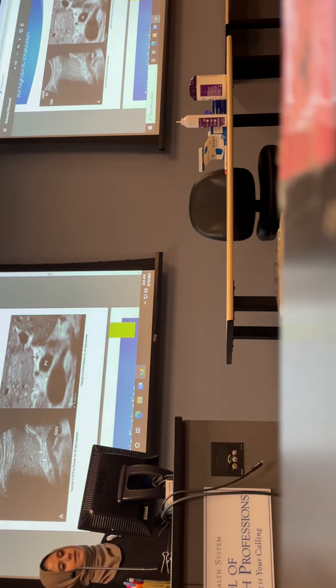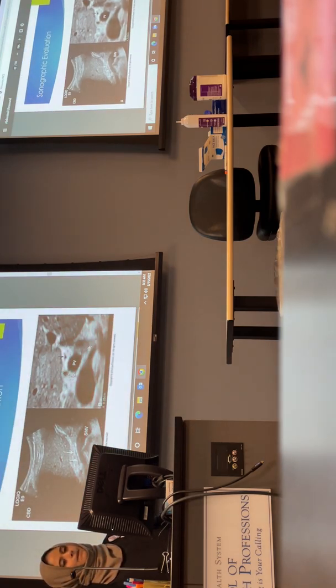What is the sonographic sign right here, guys? The Mickey Mouse sign. Make sure we know that. Here we have portal vein as the actual face. This is CBD. What is this one supposed to be? Hepatic artery. Okay.